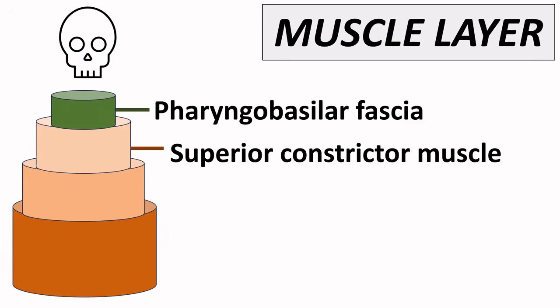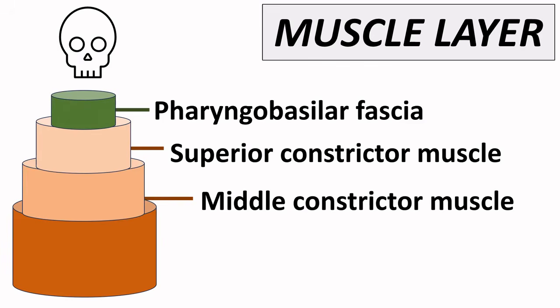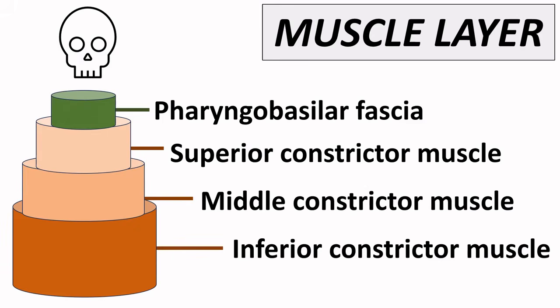Then we first have the superior constrictor muscle, followed by the middle constrictor muscle and the inferior constrictor muscle.